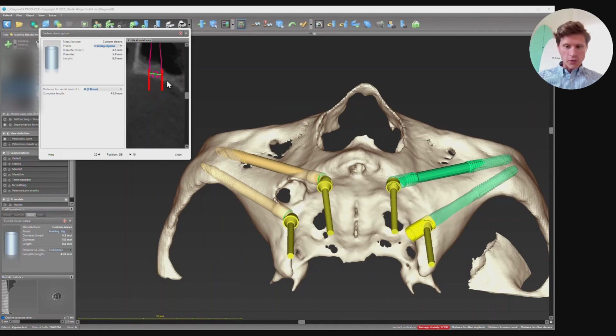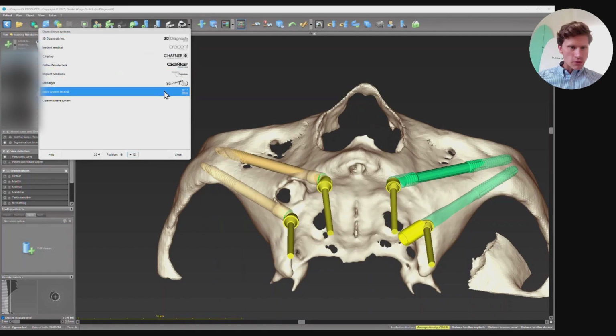And why we do that? Actually, if we put 0, you see that it intersects the bone. It's okay. And how far is it? Does it go too far or maybe less? Maybe I will put it like this, just to put it out of the bone to have this cylinder a little bit more. Then go to the next, 16.